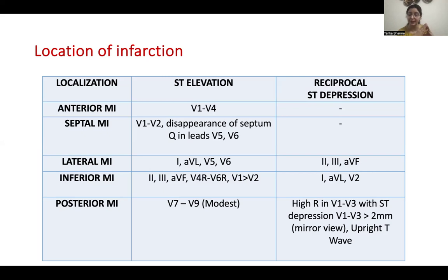Usually, the people might be having the septal MI along with the anterior MI only, which is known as anterior-septal MI. And then the ST elevation can be seen from V1 to V4. Okay, V1, V2, V3, V4 tells you about anterior-septal myocardial infarction.